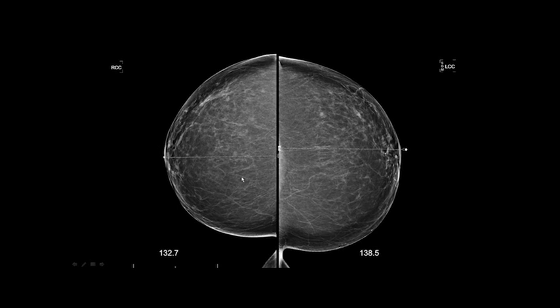Well, they're going to look at that also. Not every breast is larger or smaller than the other, so they are going to compare each breast to one another also. You can see this is 13.2 and 13.8. It's within millimeters, but you could tell that there's some tissue missing on the right CC.